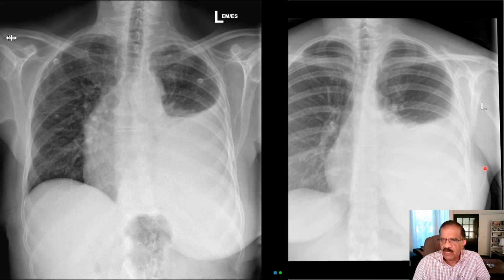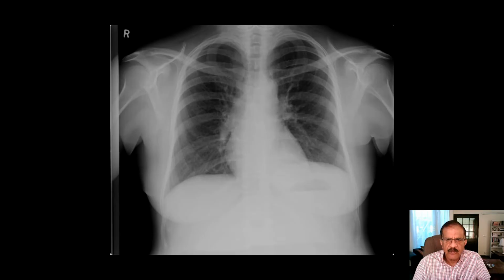So this is another x-ray. Let's see some more. What do you see? Do you see any pleural effusion here? This may be slightly tricky. If you see the right side, nice clear right costophrenic angle, nicely outlined diaphragm, nice clear right cardiophrenic angle, and no opacity here. But if you see the left side, it appears the same, normal. But then, what is this thing?